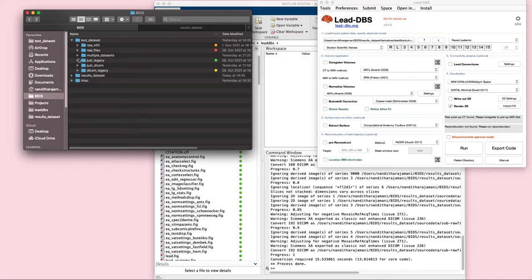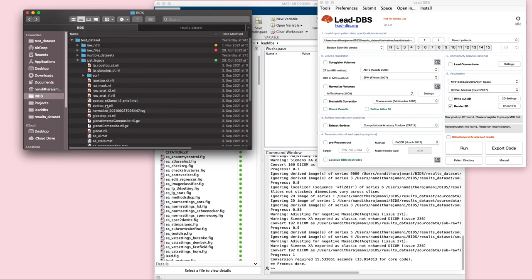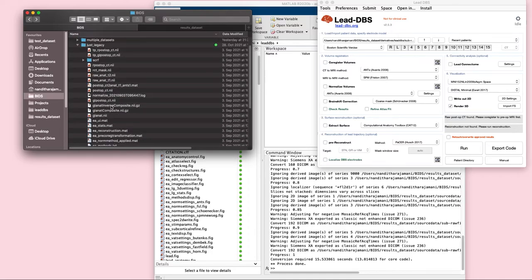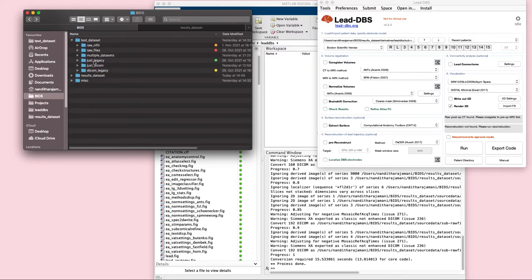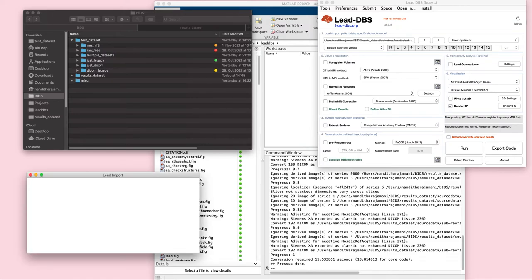The third example that I wanted to show here is the presence of a classic Lead-DBS file or a legacy dataset. So if you are, as mentioned before, familiar with Lead-DBS, then you would know that these files are specific to the classic form, and if you want to convert it to the bidsified version, we again perform the same steps. So we drag the dataset into Lead-DBS, and another dialog box opens which says old dataset is detected, will you migrate it to BIDS? So you press on yes. The lead import tool now opens and the input dataset is already loaded.